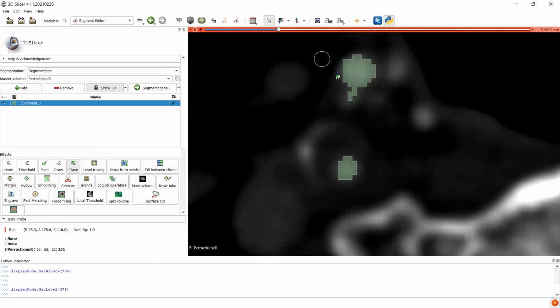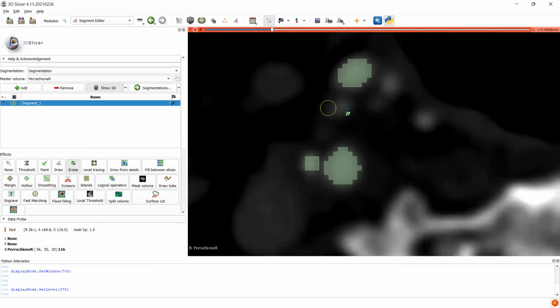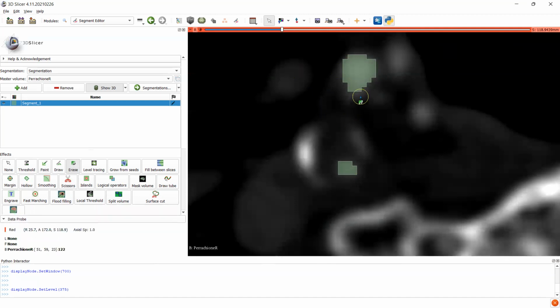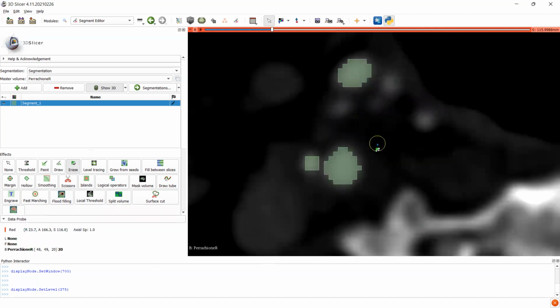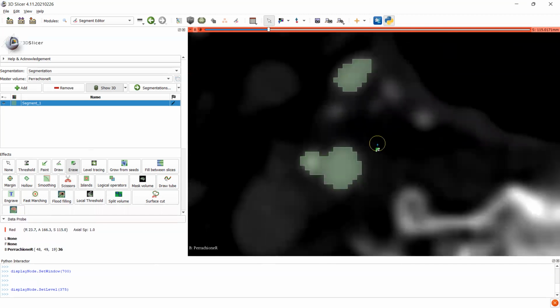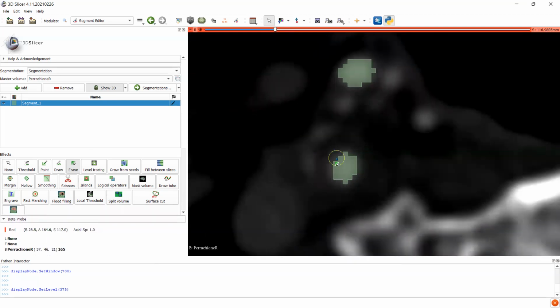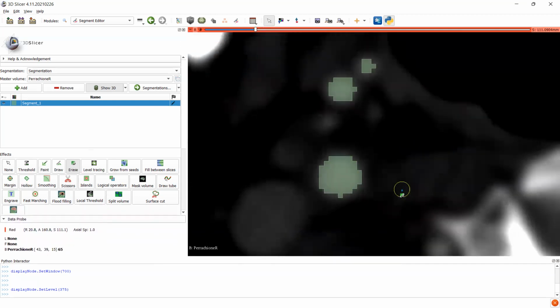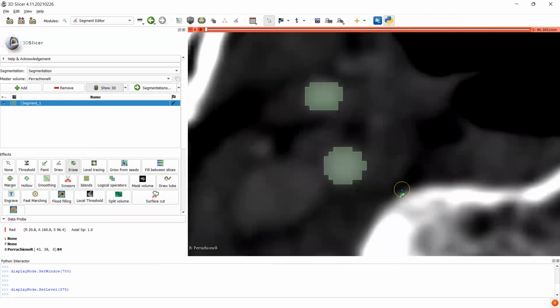You can see there's ICA is branching, ECA is branching here. Actually, it doesn't catch the branch, so that's going to look really weird. Yeah, that's better. So this actually does a pretty good job of catching the expanding here. This is plaque, it shouldn't be included. This is obviously plaque. A lot of this is kind of just repetition. Once you do a lot of these geometries, you'll get the general picture. Follow through, and there we're good.